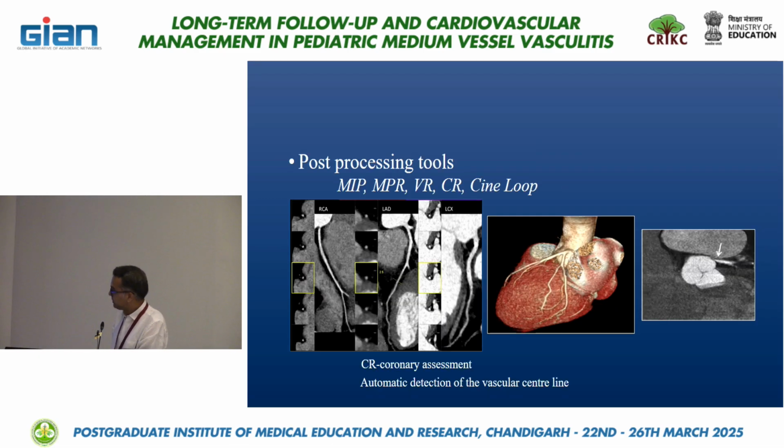So we use various images, as highlighted. First, the most important image for the radiologist is the axial image, and this is the normal CT acquisition image. We see pathology on this and then highlight it on the other images, which show the abnormality quite glaringly.